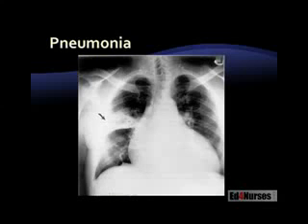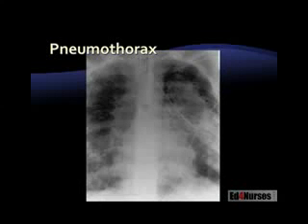Assess the pleura. Pretty dark up there toward the top, but basically pretty clear, except for this thing we got going on here on the right lung, which is on the left side of your screen. And this thing is very well encapsulated. Look how nice those margins are on that thing. And it's very bright white. So this is a very thick infiltrate. This patient here has pneumonia. Look at that, how enormous that heart is. That heart is just huge in this patient. Can't really see the abdomen going on in this particular x-ray. This is a patient who has a pneumothorax.